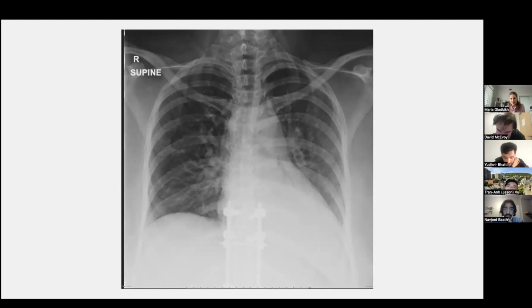Yeah, that's totally correct. This is left lower lobe atelectasis. You see kind of complete obscuration of the diaphragm, right? The ribs here look crowded. Can't really define the end of the heart and the beginning of the diaphragm too well. And we know that the left lower lobe sits here. So this is partial collapse, or actually full collapse of the left lower lobe. Great.